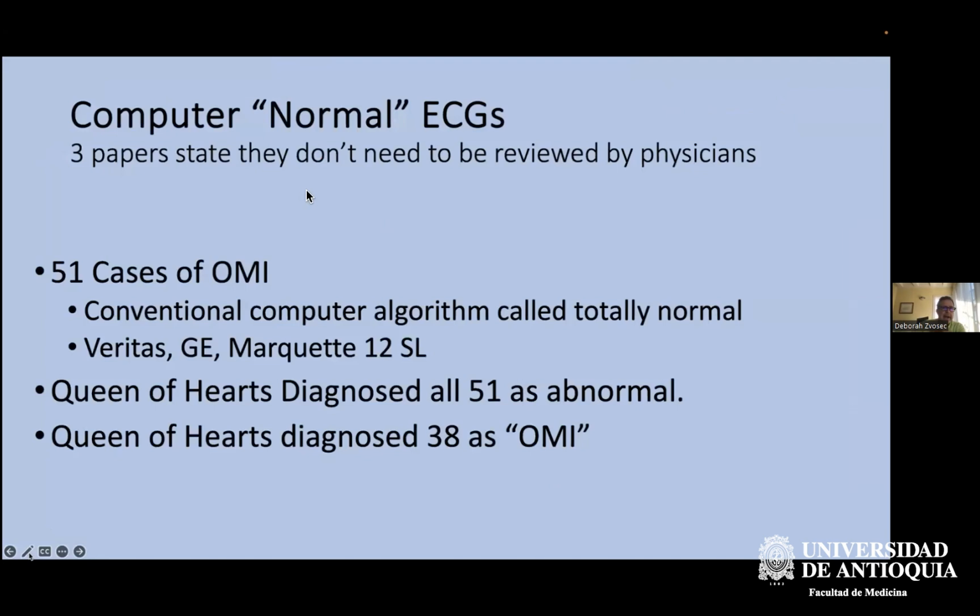So I have a collection of OMIs that the conventional algorithm calls completely normal. It doesn't say they're non-specific. It says they're completely normal. And there are 3 papers that state if the conventional algorithm says the EKG is completely normal, they don't need to be reviewed by physicians. Well, I have 51 cases of these where it was an acute occlusion and the conventional computer algorithm called it completely normal. And these are algorithms by Veritas, General Electric, Marquette 12SL. The Queen of Hearts diagnosed all 51 as abnormal and diagnosed 38 of them as OMI.